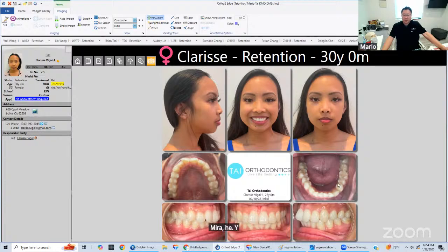Should we do anything about that? My rule of thumb is always remember what not to do. Sometimes what not to say, right? So, if she has nice stable occlusion in the back and she's healthy and functional, do I want to open a can of worms? I don't. She has nice, healthy, stable TMJ. So I decided in this situation, I should minimize or try not to move anything in the back and try to resolve the crowdings by moving the rest of her dentition. So I said to myself, perhaps bicuspid to bicuspid of some sort, right?